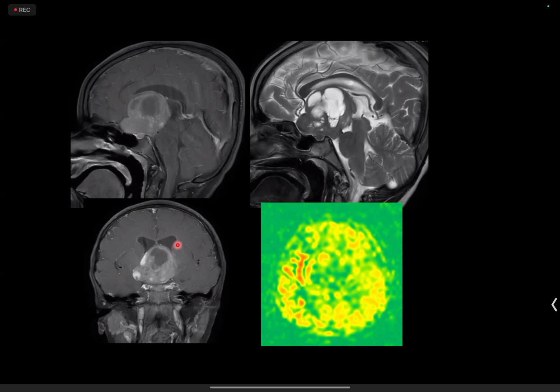Ma'am, post contrast, the peripheral solid lesions show enhancement, and on perfusion, there is increased uptake in the center, unlike in the pituitary region. So most of the lesion is hypoperfused, right? Yes, ma'am. Most of the lesion. Okay. Did you mention the adenohypophysis? The adenohypophysis appears normal. It is seen separately from the lesion.